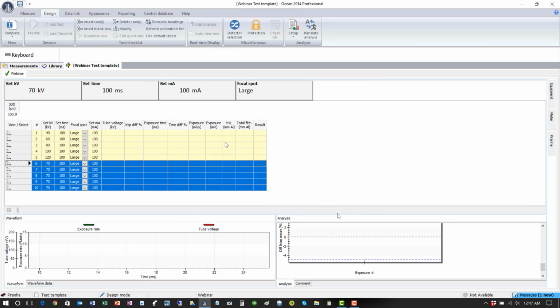Select OK, and now it's saved. Another powerful feature in Ocean is, let's say I am covering 5 hospitals, but I've got 3 other engineers that I work with that have Piranhas in Ocean as well. And now, do they have to go through all this process to build a template?